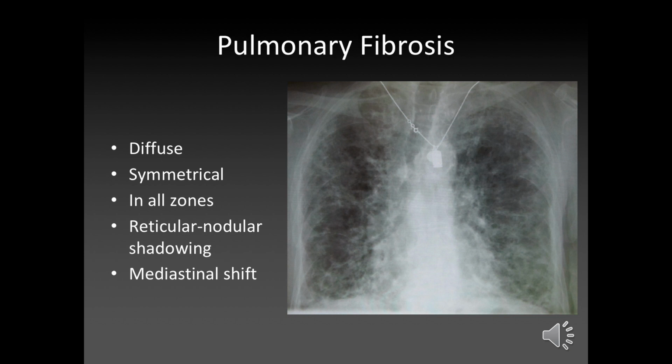So pulmonary fibrosis is a type of interstitial lung disease. And I think you do that in 4th year. And it's a big headache for a lot of people because it's quite difficult to understand. But essentially what you get is thickening throughout the lungs, and everything tightens up, and they can't breathe very well because their lungs are restricted. And that's what's happened here. So because his right lung is tightened, the trachea, which is usually pulled a little bit towards that side anyway, gets pulled further towards that side.